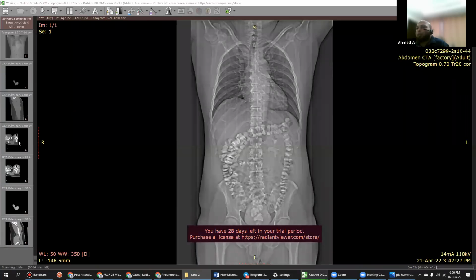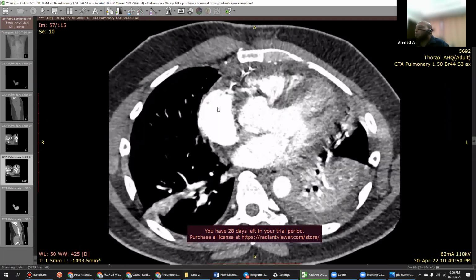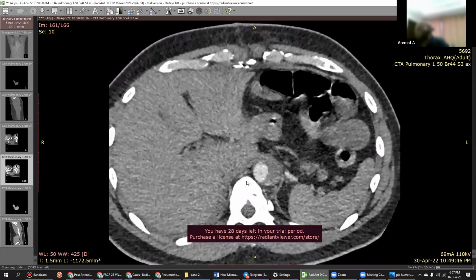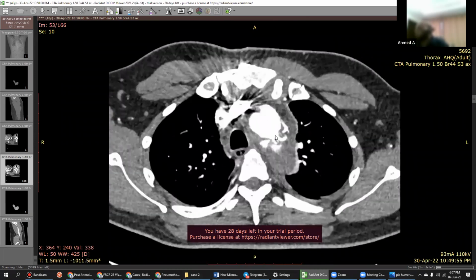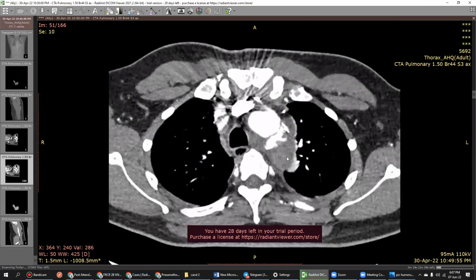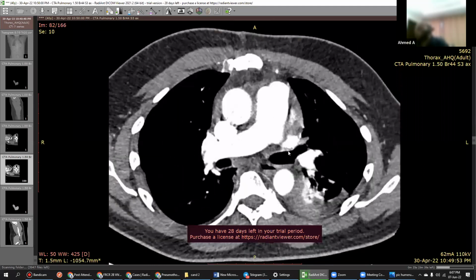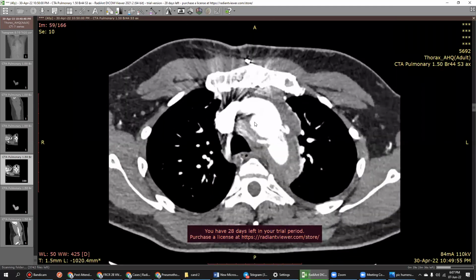I'll show you what surgery was done. This one, yeah. Okay, you can see this. This is the graft. It was not a graft. It was repaired by an open surgery. You can see the screen. Yeah. Okay. If you want just for additional knowledge, this is called a frozen elephant trunk graft. Right. Okay. Because it was involving this one.